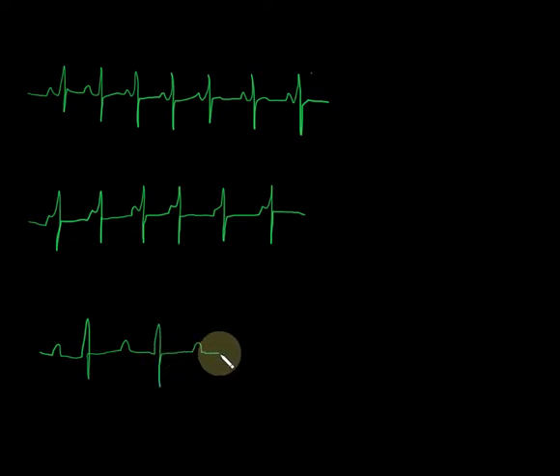And I apologize, this takes a little while and it's not going to be spot on perfect, but it gives you an idea. Now, I did dip below the line here a little bit. I'll tell you what, not so great at erasing, but let's go ahead and just kind of fudge that and clear that up a little. All right, so now go ahead, take a few seconds, and work your way through all the different questions on here, and then unpause when you're ready.